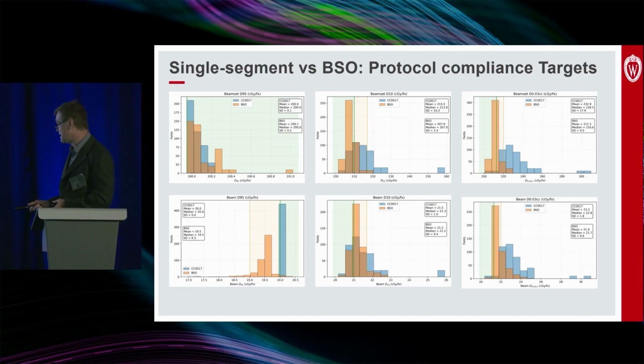The D10 here for the beam by beam D10 is a little bit varying, and the D max for the beam by beam analysis is also varying. So sorry, up here is the plan metrics, and so you can see that the overall plan doesn't really tell the story here. There's actually some breakup in the different beam-by-beam analysis when you break it down for the beam-specific objectives.